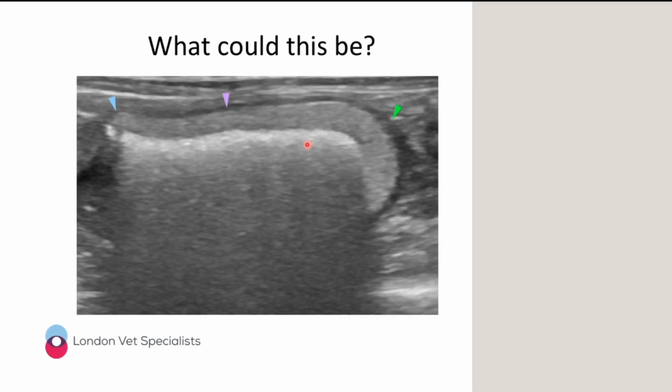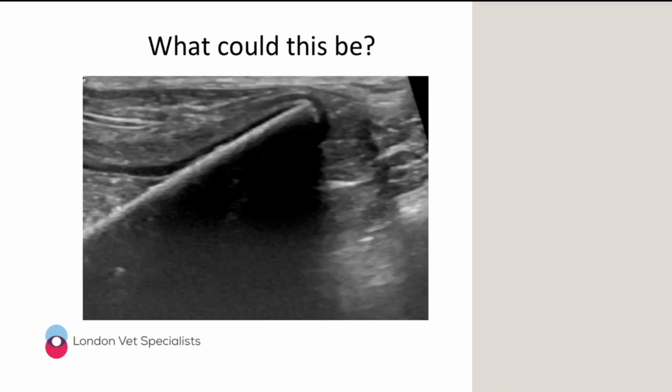If any of you guys guessed that this could be a foam earplug, then you would be absolutely right. And that's exactly what this turned out to be. So this is one of those little foamy yellow earplugs that are really common. And for whatever reason, this cat had decided that the best thing to do with this earplug was to eat it and get obstructed and have to have surgery to have it removed. So this is foreign body number 2.